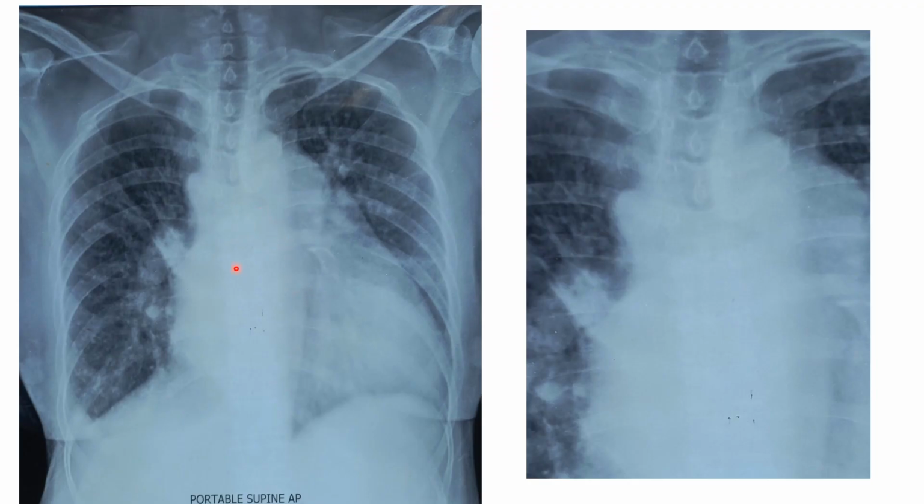So here is another x-ray. The cardiac shadow is enlarged, and if you look carefully, again here the carinal angle is widened. So I put up this x-ray with magnification. This is the trachea, and then this is the right main bronchus, and this is the left main bronchus. So there's a widening, especially this left main bronchus will become much straighter. The widening is because if there is a left atrial enlargement, the left atrium sits here, and because of its pressure this carina is widened.